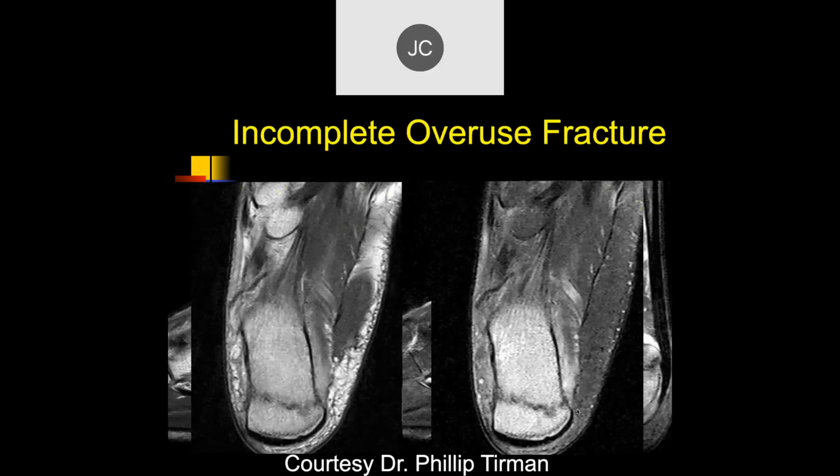MRI is actually very good at showing these. These were kind of a little bit of a dilemma in the past because most of these are X-ray negative, but now we've definitively shown that many of these are stress injuries, and MRI can really differentiate between the different causes. It often can take a while for these to heal, and a lot of people would get disgruntled and concerned about what it was because at 2 or 3 months out, they may still be symptomatic. I think clinically you can probably pick it up pretty easily.